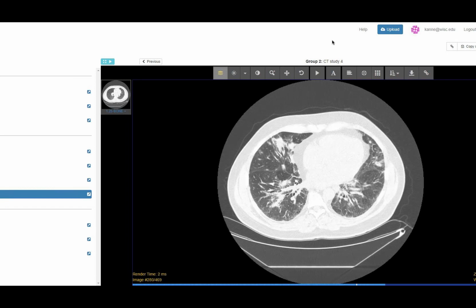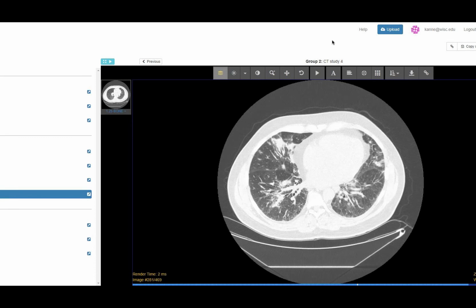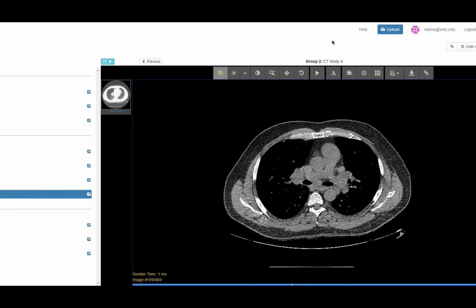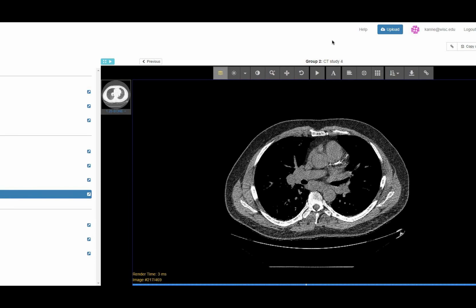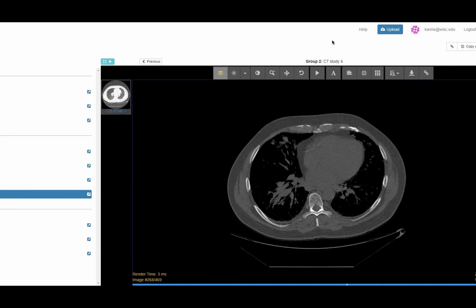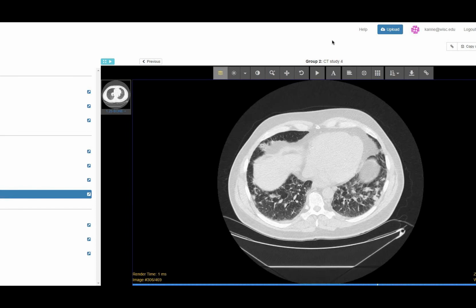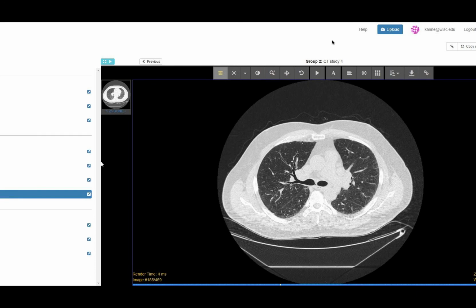So with this thick peribronchial consolidation, but also all of these nodules. And if I go to the soft tissue windows here, let's see if there's a soft tissue one. Yeah, you see there's this pretty bulky mediastinal and hilar lymphadenopathy. So the patient actually got a transbronchial biopsy at that time. So this is like, I gotta say, 10 years ago. And this was all non-caseating granulomata. And so a diagnosis of sarcoid was made.